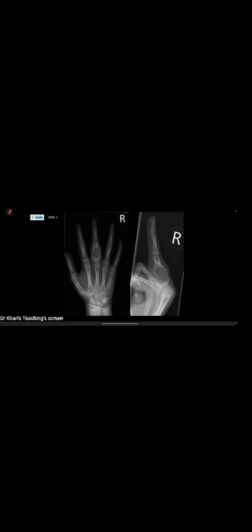Okay. So I would agree doing an MR would be helpful if the patient were having symptoms. Enchondromas are fairly common. I wouldn't suggest doing an MR for every enchondroma that you see. But that was really well presented, really nice. You would hope that if you were given an exam case like this, the case would have that very typical ring and arc chondroid matrix. They've given you a bit of a tricky one, but you handled that really nicely.